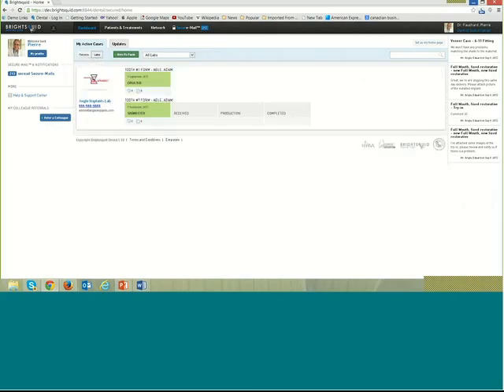And once I've got it in the lab view, I can follow the same sort of formula for the actual production of that case. And so we really have tried to separate sort of patient care versus patient delivery, which is the lab, the milling center, and the design center. And each of these organizations might have their own workflow, which can be customized according to how they choose to deliver their product.